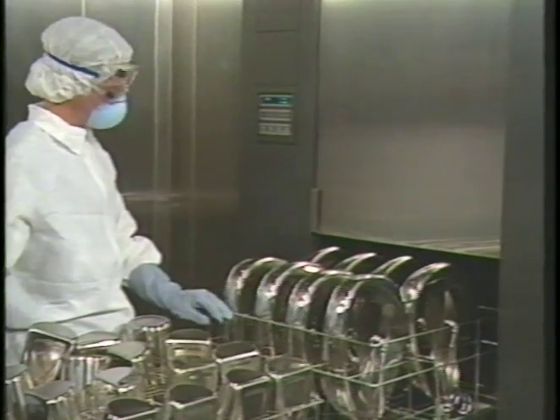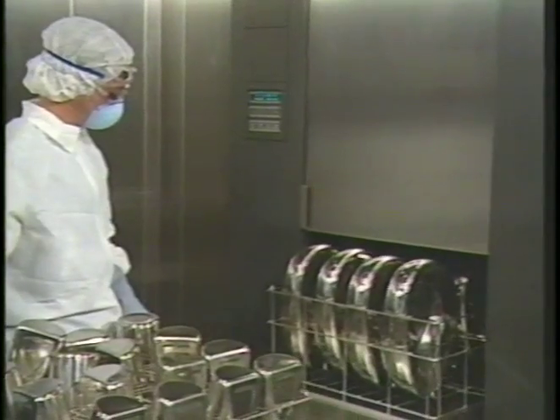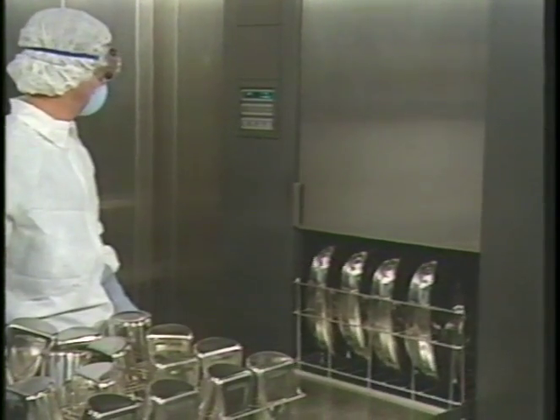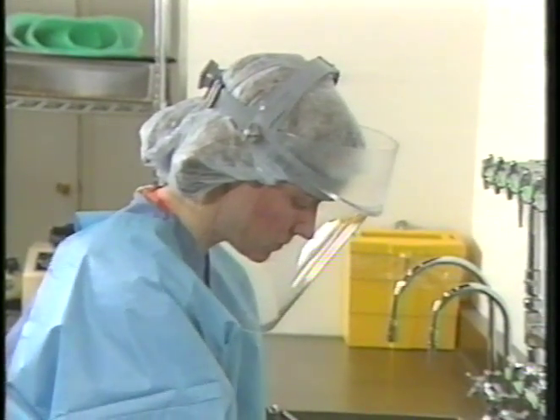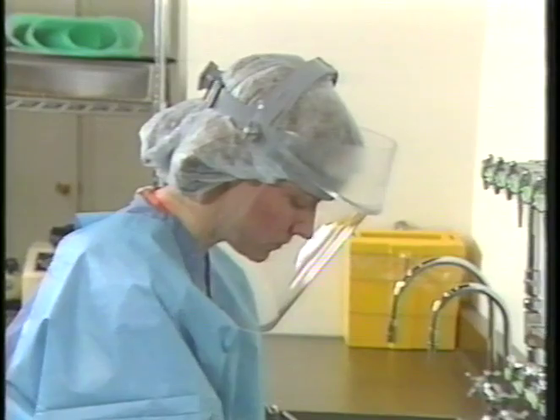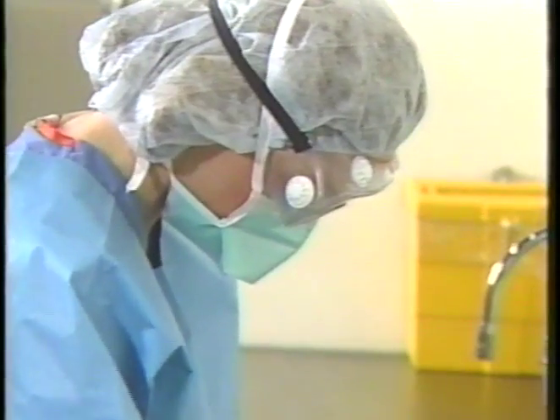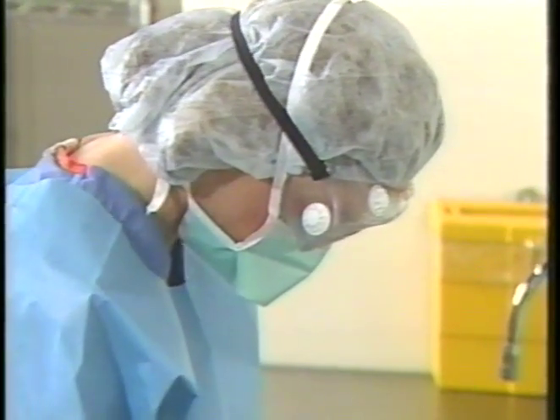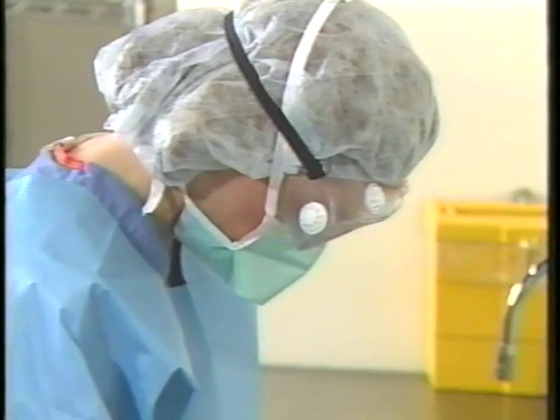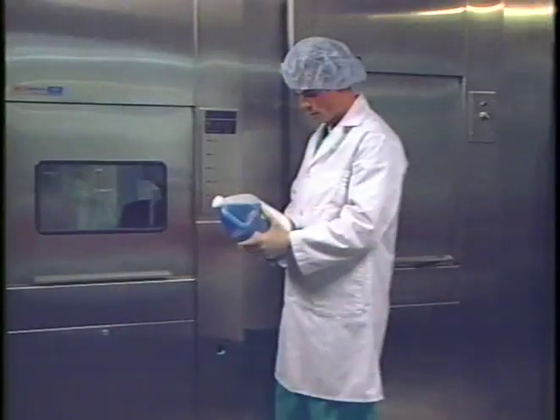Hair should be covered and feet should be protected in some type of protective fluid-resistant boot, either single-use or reusable. Protective eyewear must be worn to avoid splashback or foreign material entering the eyes during washing. Also, if the items are contaminated with human blood and/or body fluids, a high filtration effective surgical type face mask and gloves should be worn.